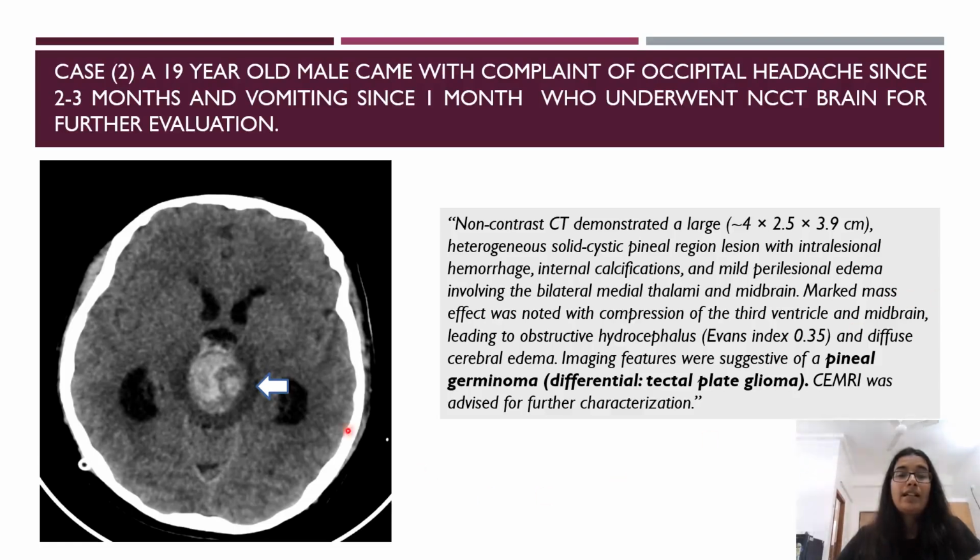Another case is a 19-year-old male who came with the complaint of occipital headache since 2 to 3 months and vomiting since 1 month, who underwent NCCT brain for further evaluation, where we can see in the pineal gland region a heterogeneous solid cystic lesion with intralesional hemorrhage and internal calcification. There is mild lesional edema and mass effect in the form of obstructive hydrocephalus. Imaging features were suggestive of pineal germinoma, and differential diagnosis of tectal plate glioma was given.